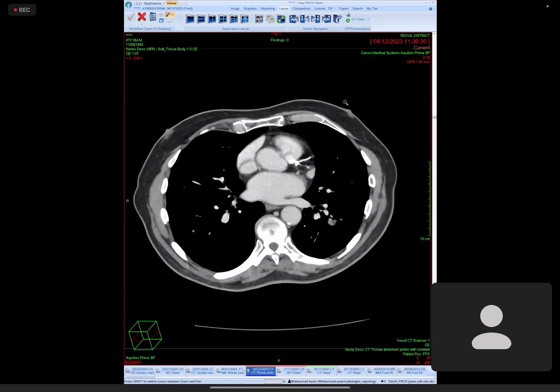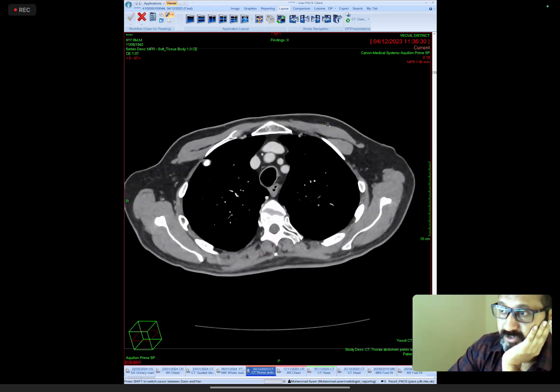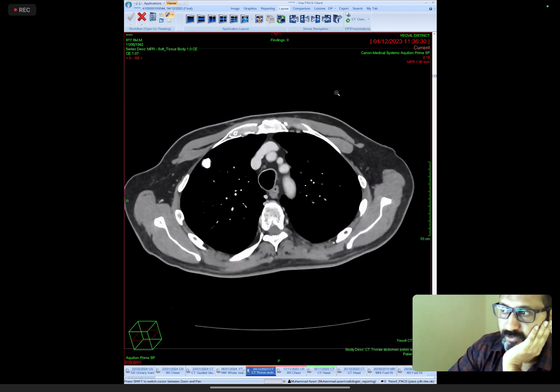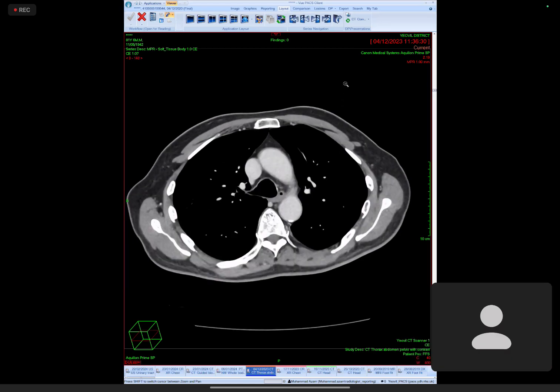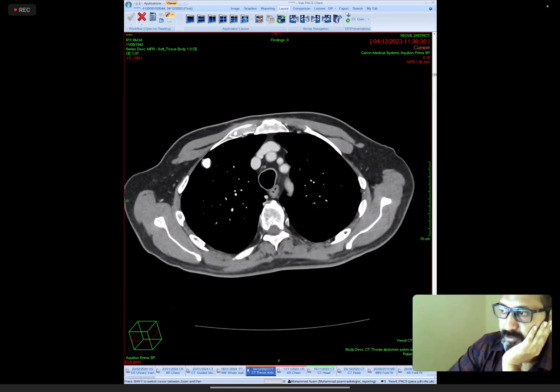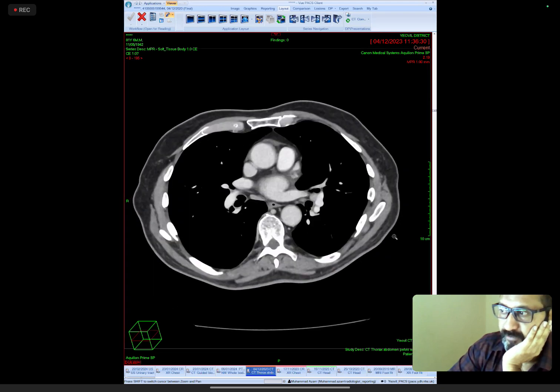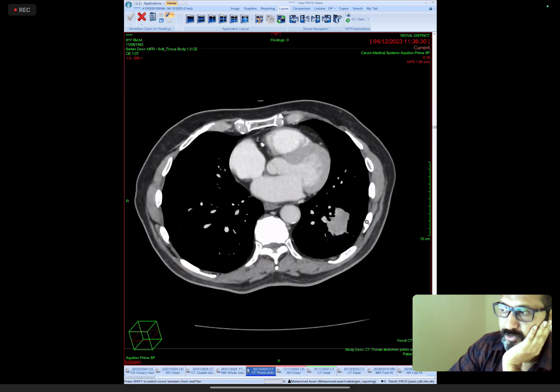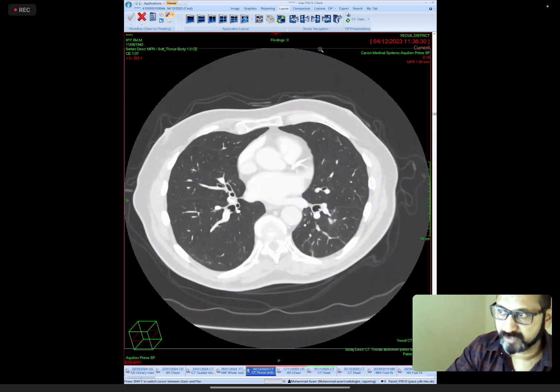And here, you took a lot of time for aneurysm and this and that, probably because of hemoptysis, I'm assuming. Here you disappointed me. But again, you gained the pace and you found this opacity. Once you found the opacity, you should have asked me for the lung window. You didn't ask me the lung window at all.